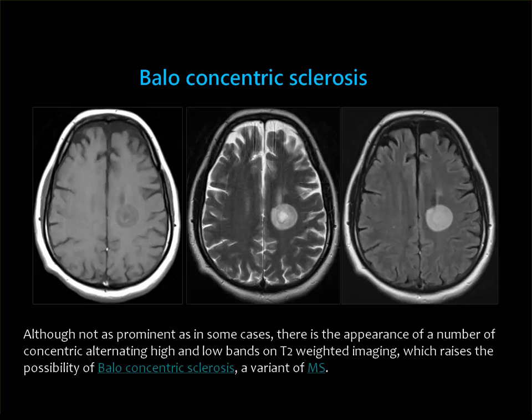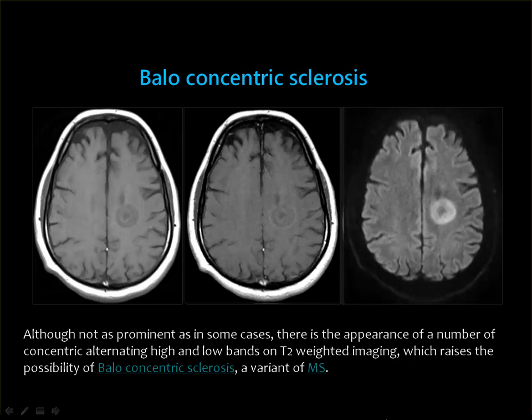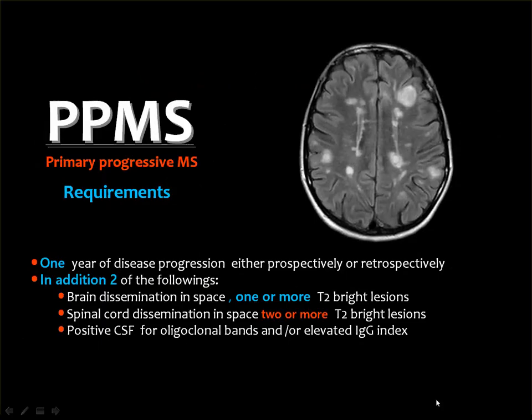And many times, if MS is not in your head, then you may proceed to diagnose other possibilities which are far away from the real diagnosis. If you inject the contrast material, you get faint marginal enhancement of the rings. And on diffusion weighted images, you get restricted diffusion, as you can see.